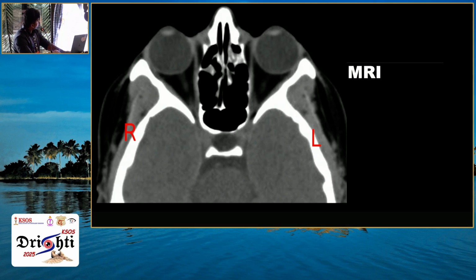This is an axial image. We will come from the anterior. We have two round symmetrical eye globes here, and anteriorly we have two slightly hyperdense structures. These are the lens, and the midline is the nose. And here we have nice cone formation of the orbits. And posterior to the orbit, this thin, linear, slender structure is the optic nerve.